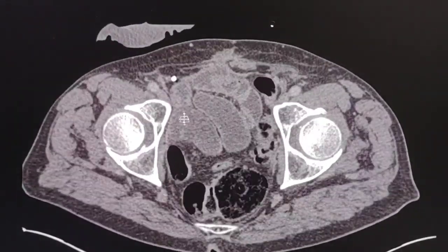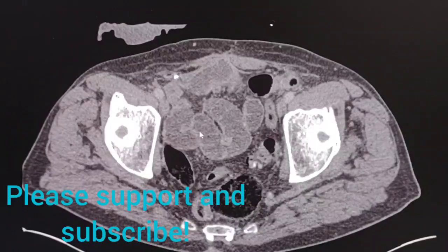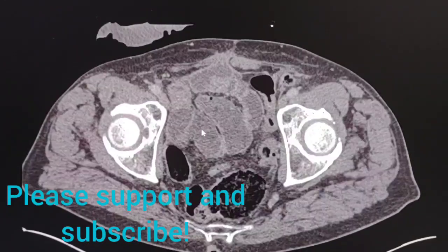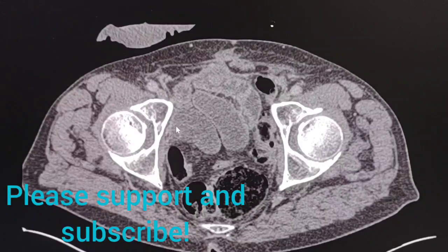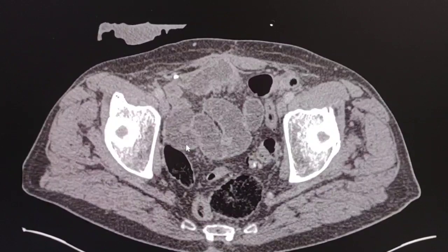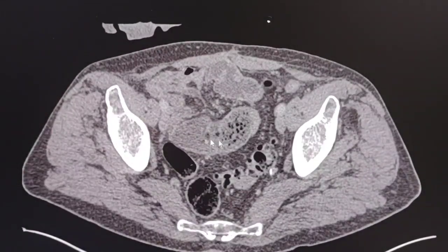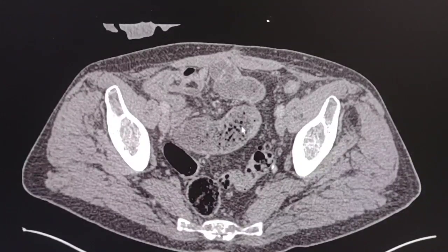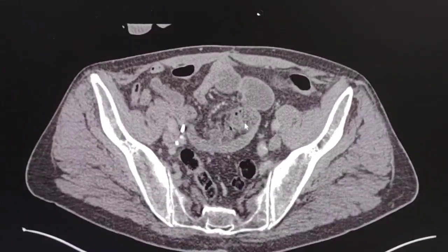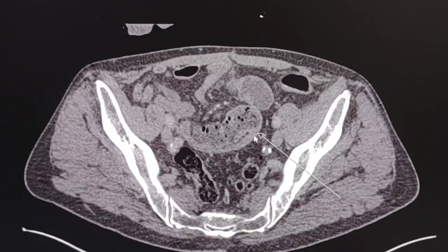Let's follow the dilated bowel loops from that point. Here is obviously dilated. Let's follow it. Here it goes this way. Here, here, here. Here is the fecalization, and there is an abrupt stop right here. So this is the transitional point.